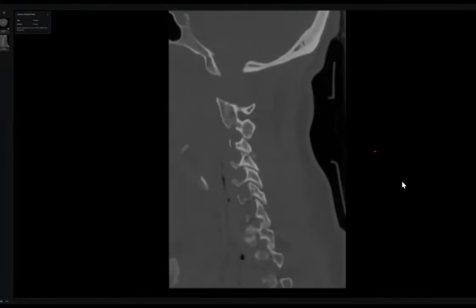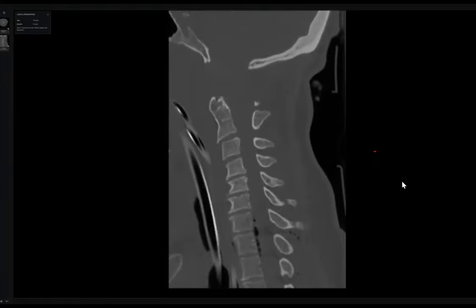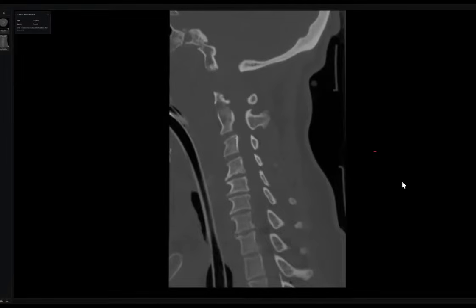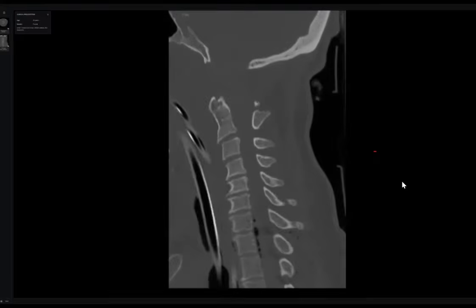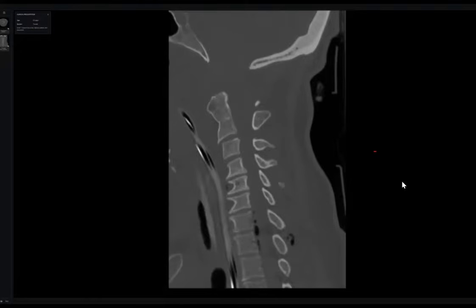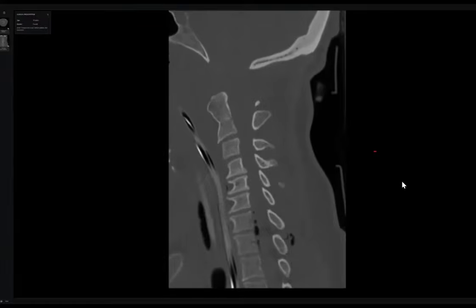What's your final diagnosis? So this is a case of atlanto-occipital dissociation. Is it dissociation, or separation? With the fracture, the most accurate term is dissociation. But if you forget, separation is very easy. And yes, there is also a fracture of the second vertebra.